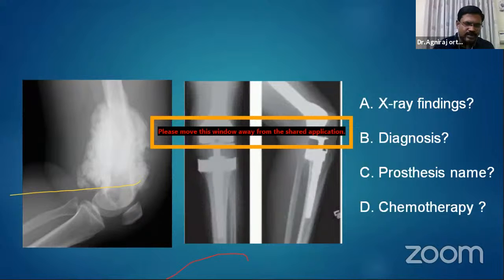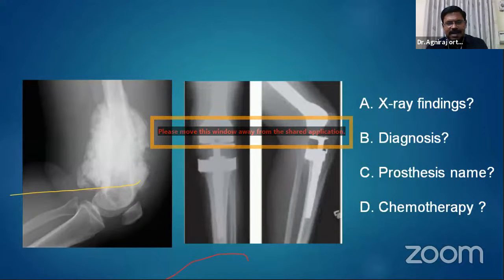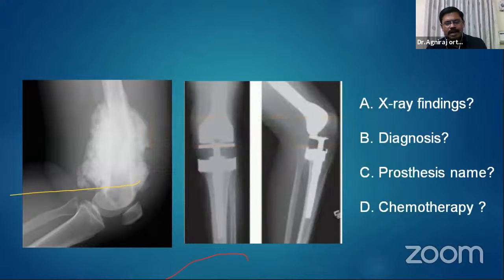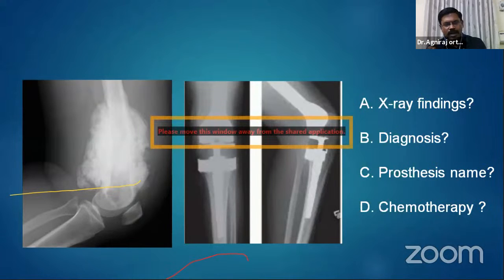See, you didn't follow the class. We have divided that into lytic and sclerotic. Remember that. Lytic means radiolucent, very simple: radiolucent, dark color. Sclerotic means white in color, a blastic lesion. So it is either white in color, or radiolucent, or a blastic type.